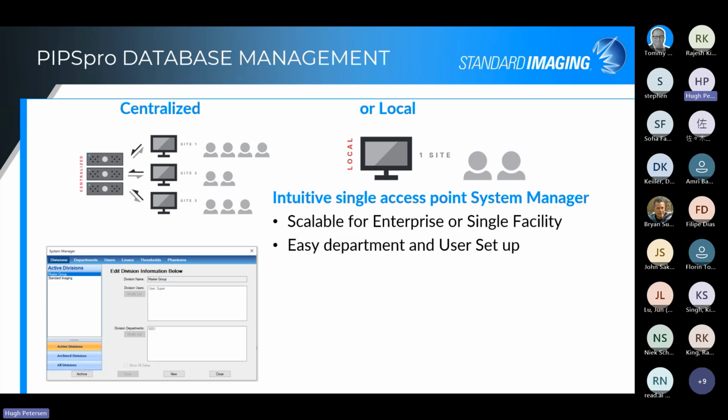It has easy department and user setup. In the user setup, there are different security levels to allow different personnel access to different components of the software. For example, a therapist may only be able to perform the tests, but won't be able to change any thresholds, move or delete things, or add or delete Linac systems or CT simulators, things like that, where you might have more of an administrative role for those capabilities.